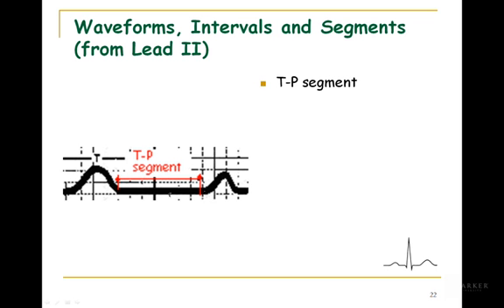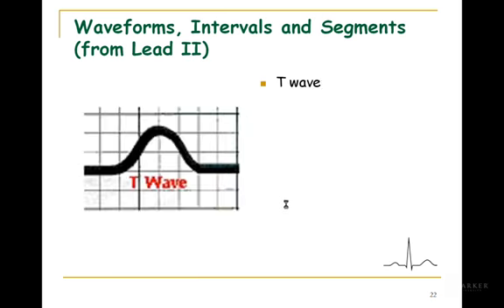But you're also going to allow a variation, just like the ST segment, of a millimeter above or below the J point. When we look at myocardial injury and ischemia, in lecture I'll be discussing why you want to look at that particular segment more than the ST segment to evaluate if there's any current flowing in the heart when it should not be. Okay. You also have, we mentioned the T wave.